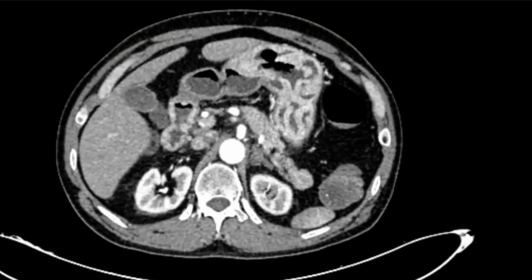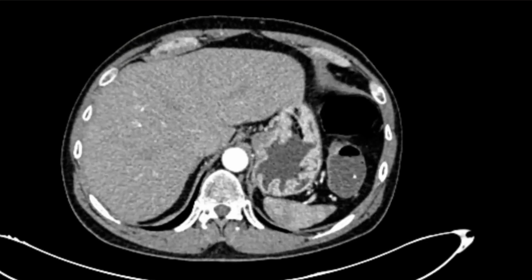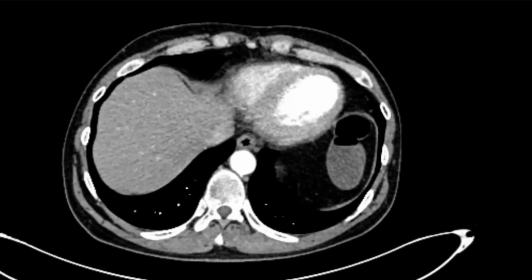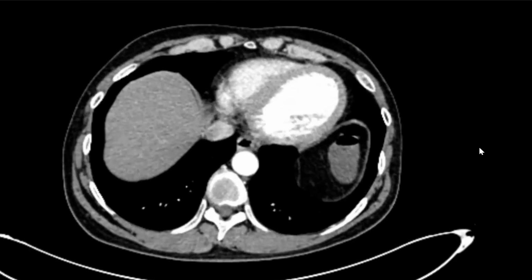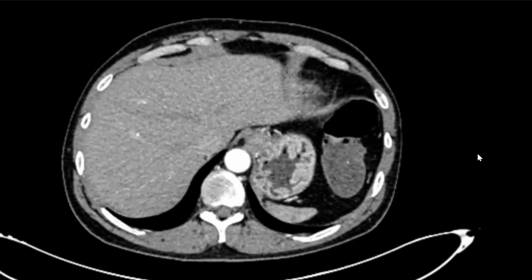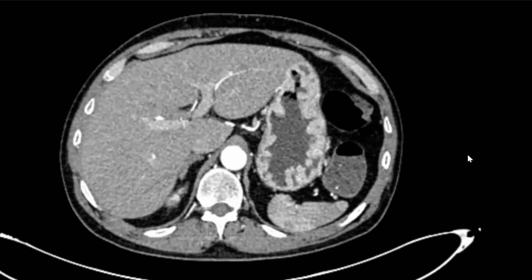As of now, it seems like peptic ulcer disease. I would like to inform these findings to the referring physician. Will refer this patient to upper GI MDT for discussion and would advise upper GI endoscopy for confirmation of the findings.